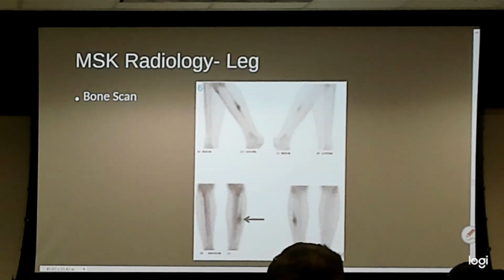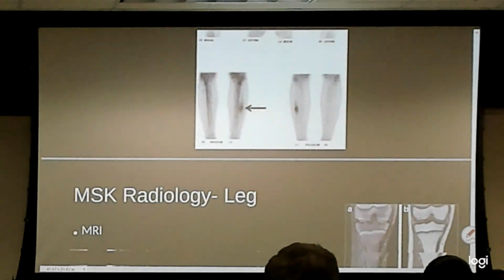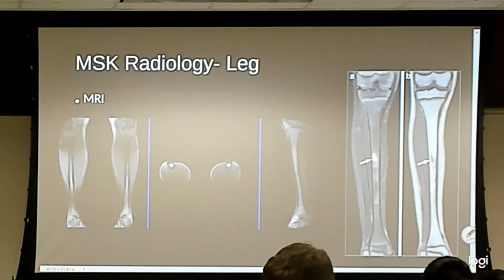Bone scan is usually a whole body study, and I was fishing for other places, femoral neck, namely, to see if this patient was suffering from additional stress fractures that would change their ability to continue to be in military. So if they're in basic training, AIT, second phase of training, and they have that many stress fractures, that's not a good sign. It's painful for the patient, but not awesome medically either.